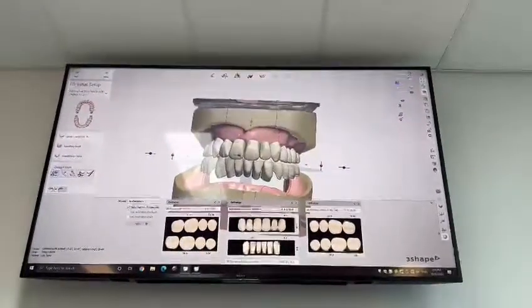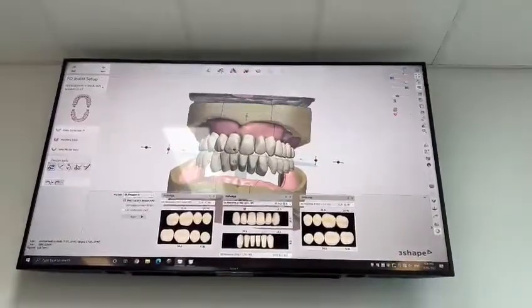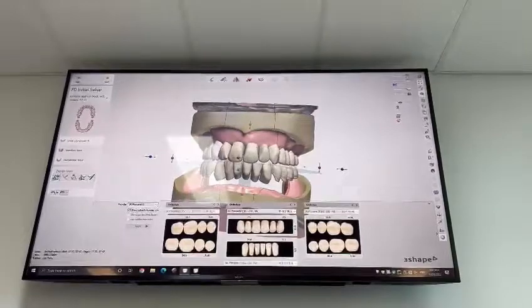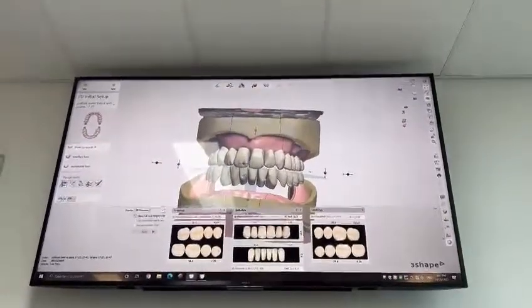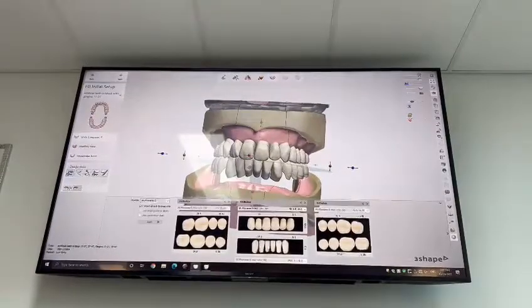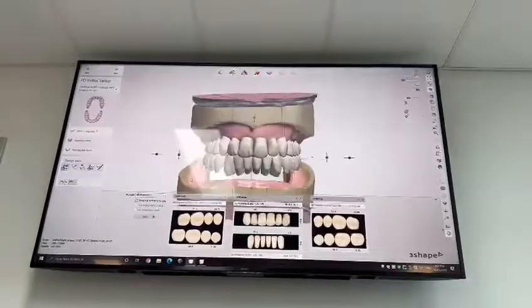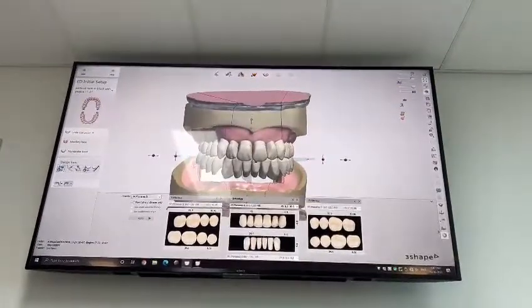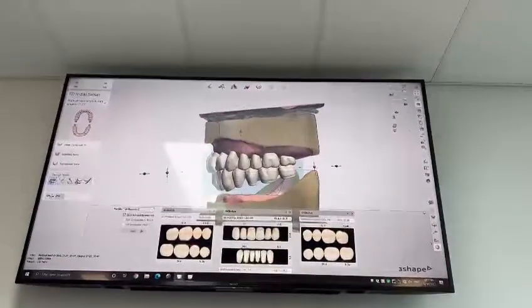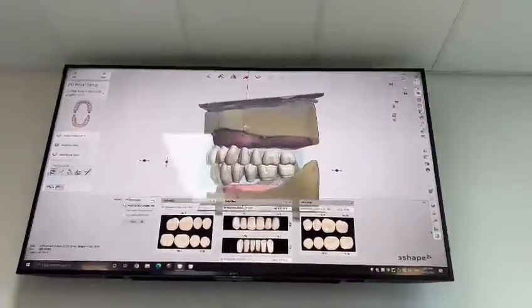So this puts it in relation to the dots you've made and the occlusal plane you've established. You can go, oh, it's way off, and go back and change those, but you're almost better off just moving it at this point. If I'm assessing this, the occlusal plane should be coming about 3/4 of the way through these retromolar pads. So I'm going to correct this like this.